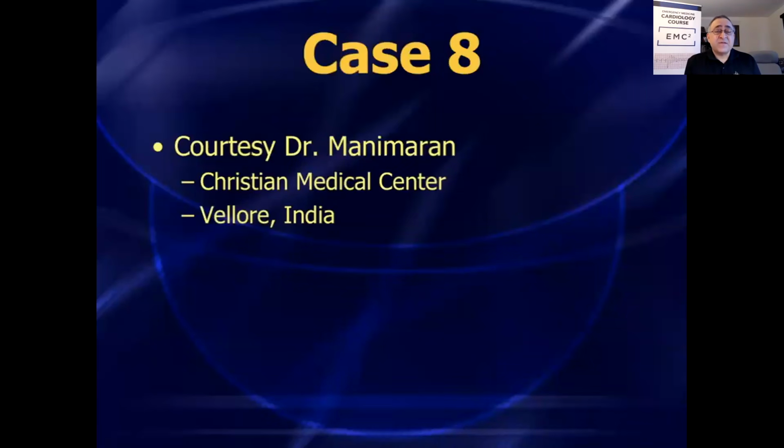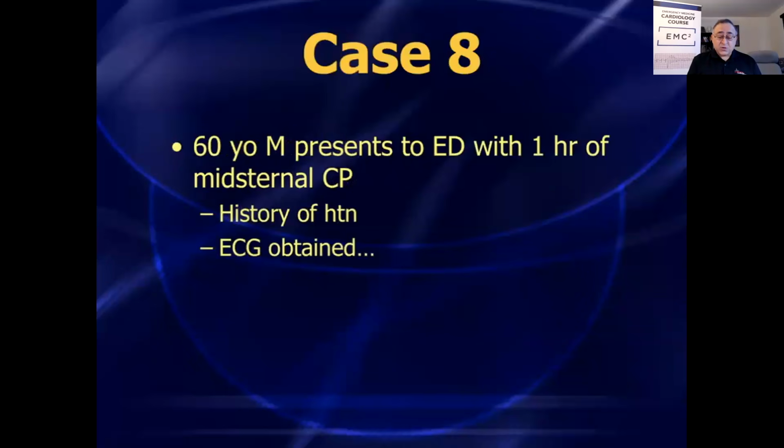This is sent by a physician in India. And this wasn't actually his patient originally, but he ended up seeing the patient on a second visit. A 60-year-old man comes in with 1 hour of mid-sternal chest pain. He went to another emergency department. History of hypertension, maybe a couple other risk factors.